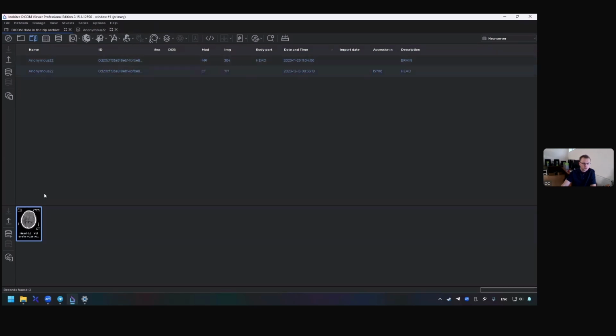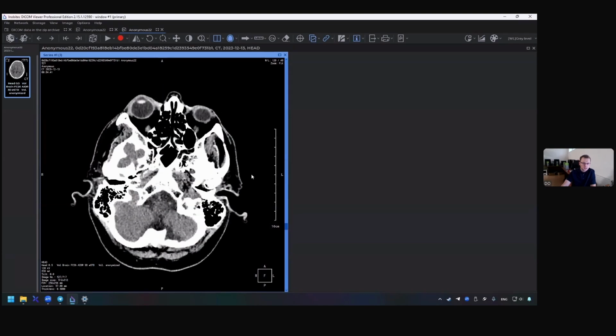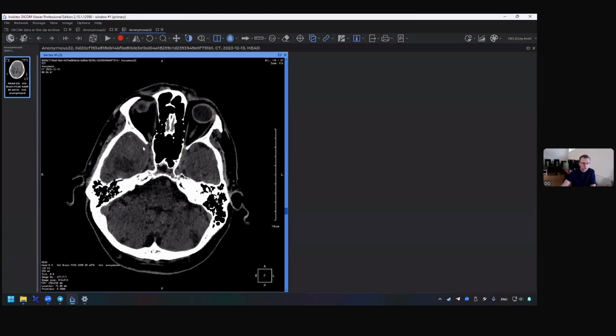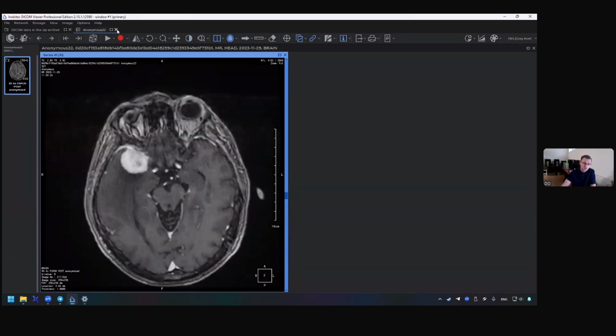And on CT scans, we can see, one moment please, bone infiltration here. But we don't have a well visualized tumor due to the absence of contrast enhancement. Let's fix this issue using layer fusion.